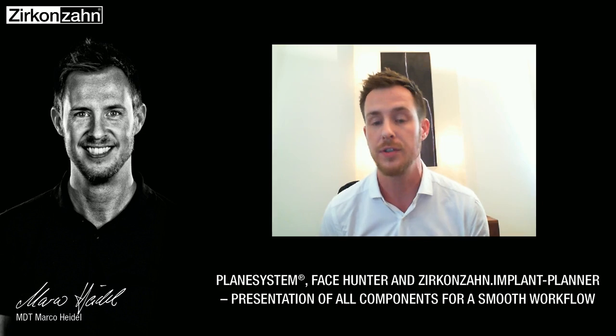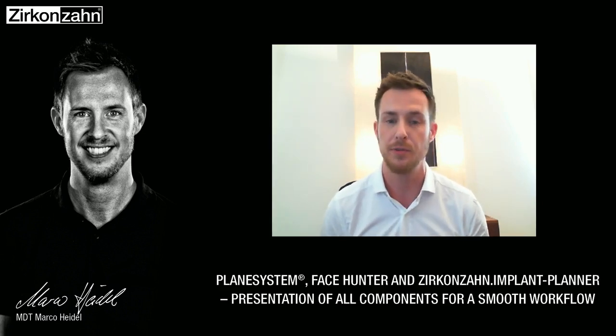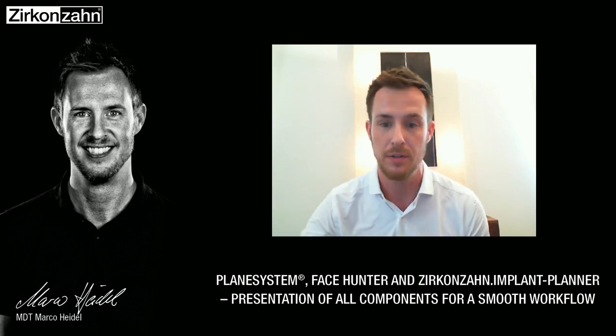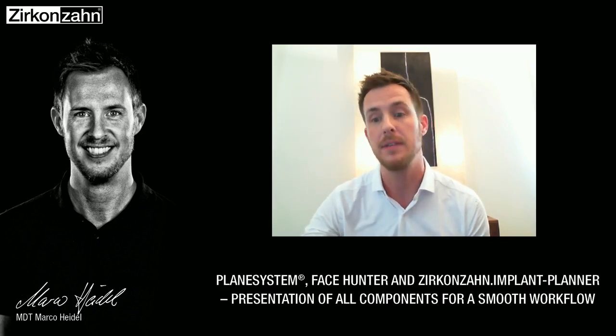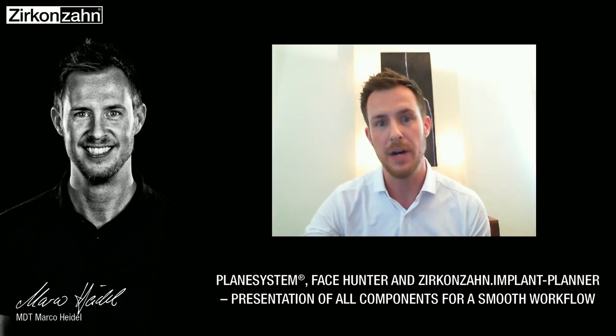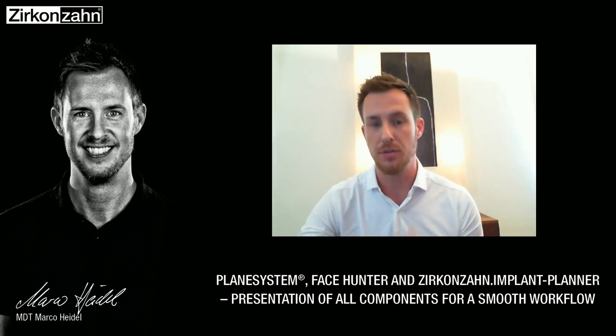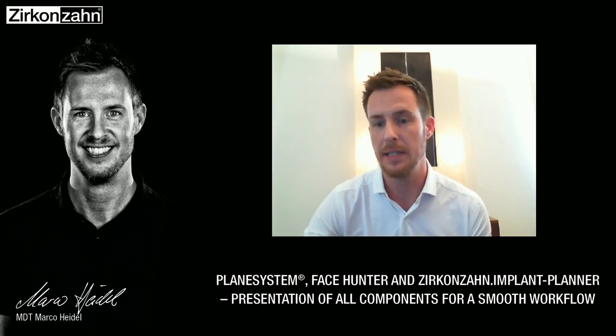As you can see, the translucency and the opacity of this material come really close to the natural situation, to a natural tooth. It's a very, very nice material. And here is another example, also just stained onto the surface. There are no layerings with porcelain at all. It's a very, very nice material. If somebody still wants to use porcelain, this is not a problem at all.